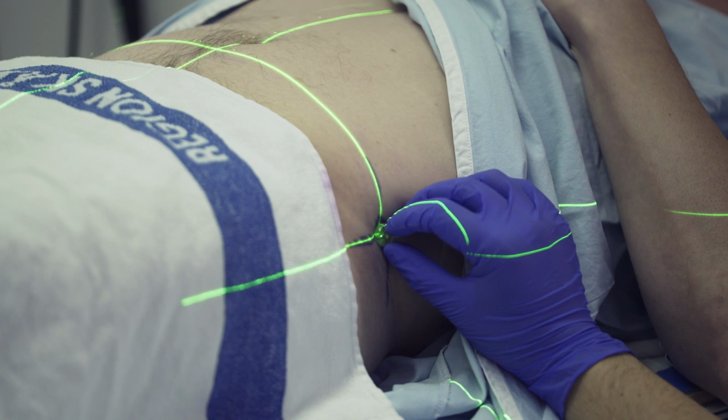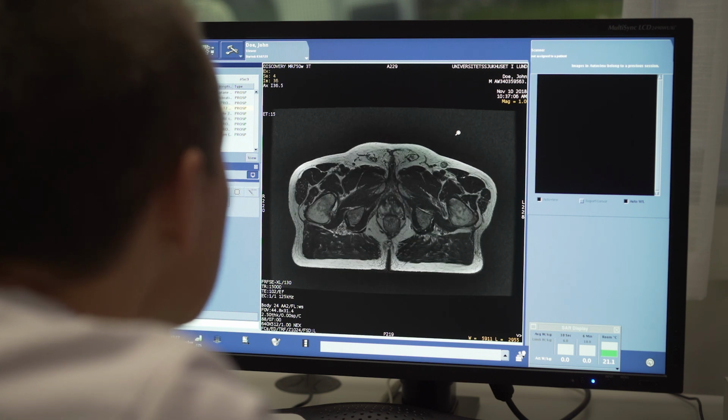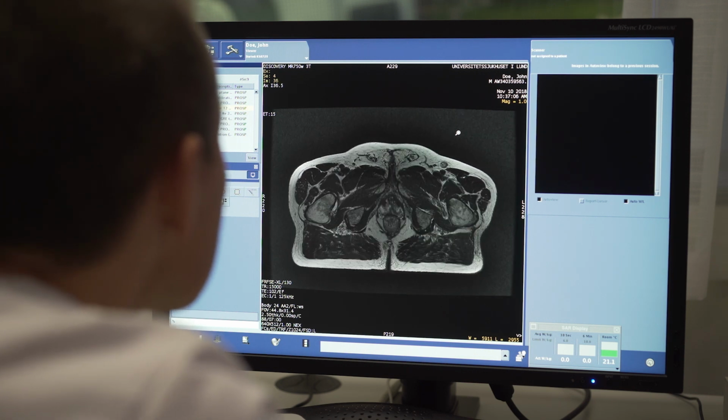Whatever method you choose for generating the synthetic CT, one or more MRI acquisition sequences must be acquired. At Skåne University Hospital in Sweden, we've been using Spectronic Medical MRI Planner to do the conversion from MRI data to synthetic CT data. For generation of synthetic CT, a T2-weighted image with a large field of view to cover the body contour is required.